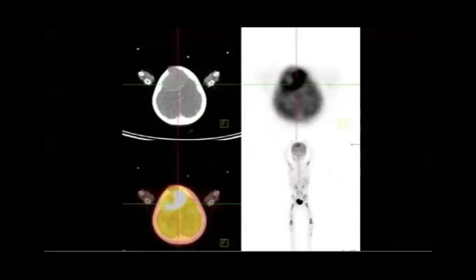If you describe this one from the CT image, you can try: a hyperdense lesion. How do you describe these changes? This patient is within the pediatric age group and has a lesion. Can you see any changes in the overlying bone, the calvarial bone? Nice, Nermeen, perfect. Metastasis from neuroblastoma would be a very nice differential.